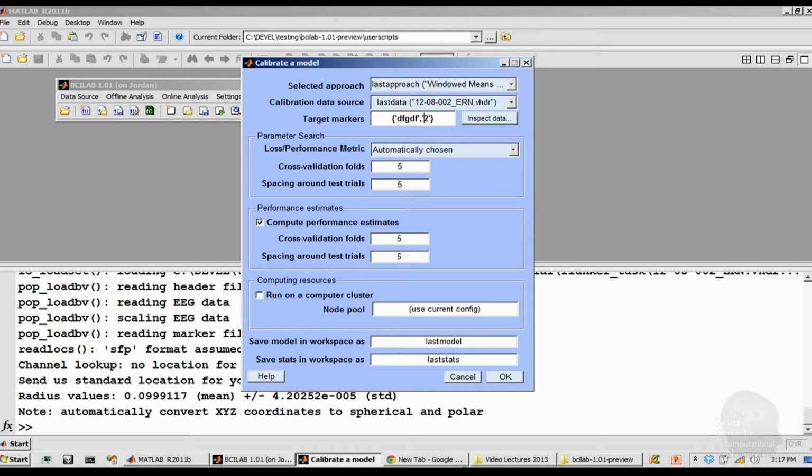So this could be my first string. This could be my next marker string or so. This would be mapped onto 1. This would be mapped onto 2. What I want is I want to have subgroups. And this is with nested cell arrays. There's documentation about this if you want to read up the details. So basically, if I had 3 classes, I could say, OK, my first marker, say, my marker 1, assuming that it's in a data set, then my marker 2 or so.